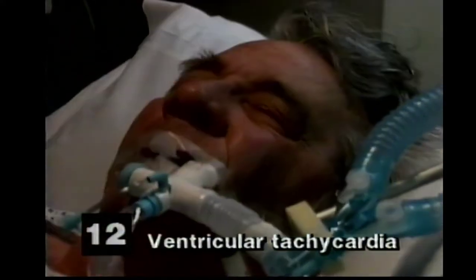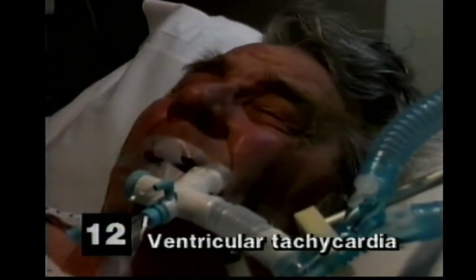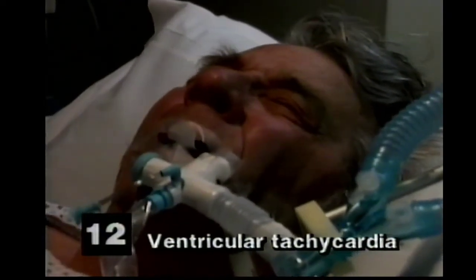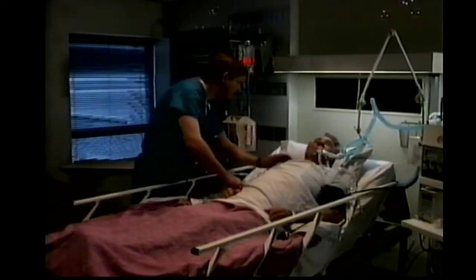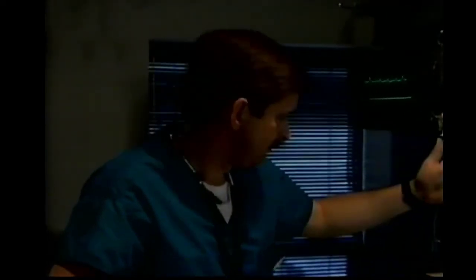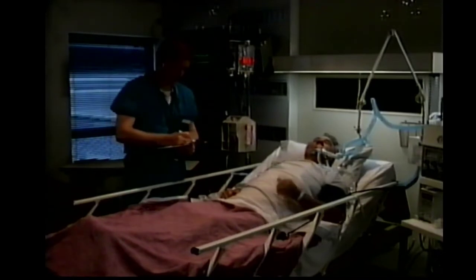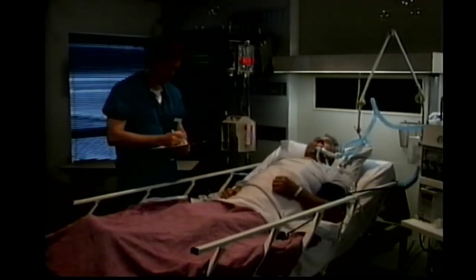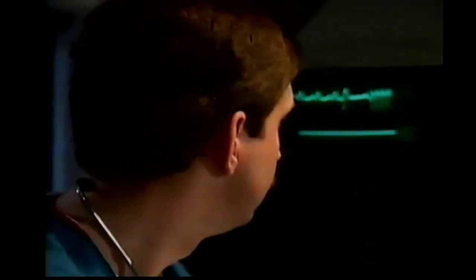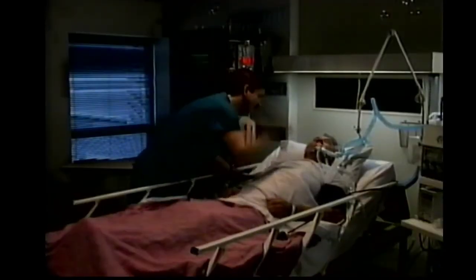This 62-year-old man was admitted to the ICU 2 days ago with chronic obstructive pulmonary disease and respiratory failure. He has been in acute distress since admission. He has hypokalemia and has also developed mild congestive heart failure. The monitor shows multiple PVCs despite lidocaine and potassium replacement. Suddenly, he develops a rapid tachyarrhythmia that lasts briefly.